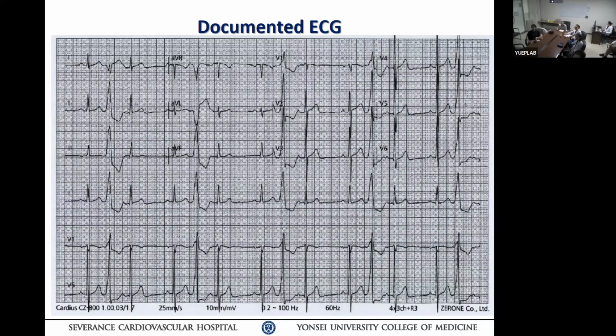But then AVL has a what? Deepest S wave. That means AVL is where? Lateral, not lateral. So you need to be more precise than that, EP guys, okay? And what else? Why is lead one not a QRS complex? PVC. That will give you the answer. Why is that? If you had a left lateral focus, would it give you lead one such a notching?